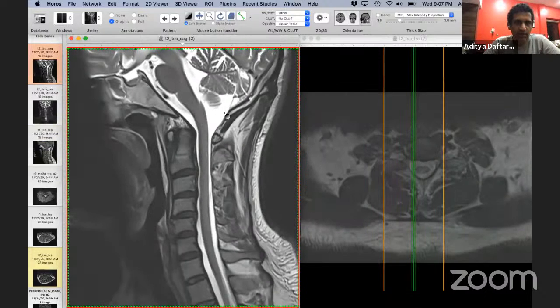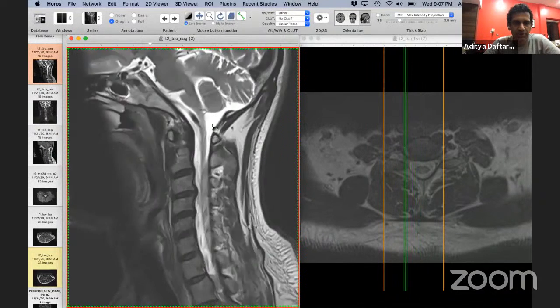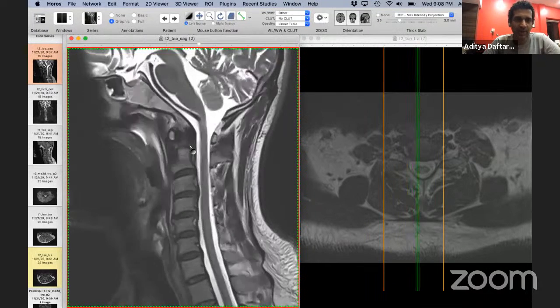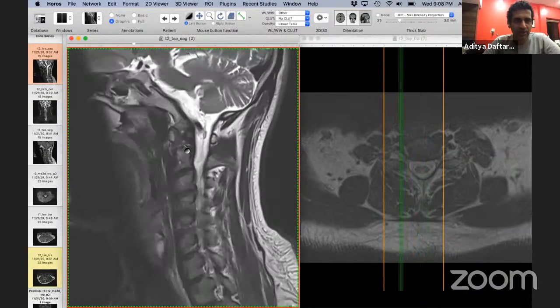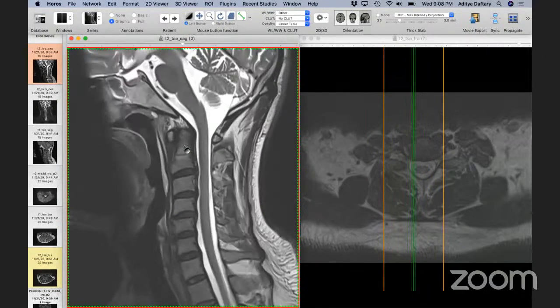You can look for craniovertebral abnormalities. You look for if there is any cerebellar tonsillar herniation, which is important for you to find. You look at the dens itself to see if there's an os odontoideum or an old fracture or something like that that is not united, which could lead to some craniovertebral narrowing here. It's important to look here at the atlanto-occipital articulation to make sure there's no developmental fusion, because that's a common area that you can then develop problems with.